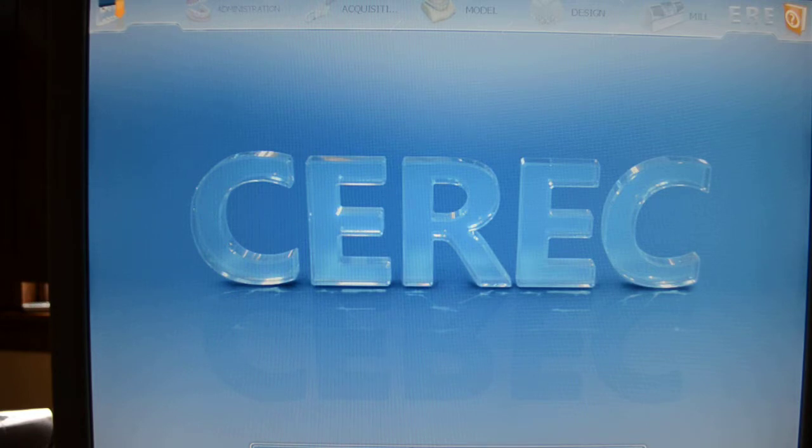So highlighted on this page is import case. You can do that if you happen to have an older CEREC and you need to bring it into your new CEREC. If you happen to be on another machine in someone else's office, you can import things. You can also work from a laptop and bring cases in and out. Licensing, obviously not a big concern for us now. Configuration, window mode, how the screen looks. Basically about CEREC is your help desk, and if you want to get out, you can get out.